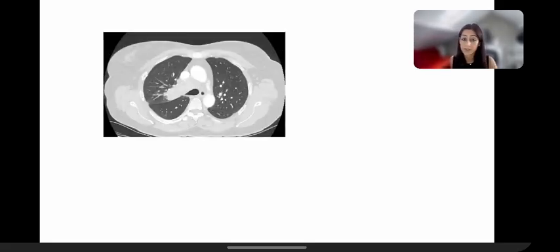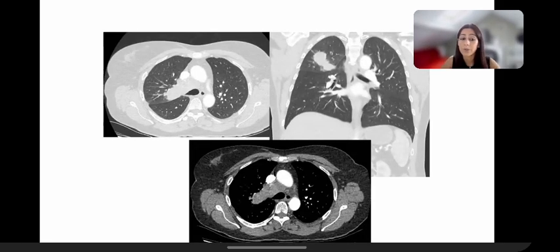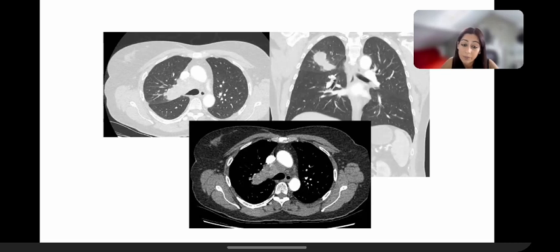And obviously, all our biopsies we discuss in our multidisciplinary meeting. That's on a Thursday, and when this was being discussed, our pathologist asked for a chest radiograph, and I have to be honest, we didn't really have one. And we did a CT after that. This was a case of bronchogenic carcinoma with metastasis to the left greater trochanter.